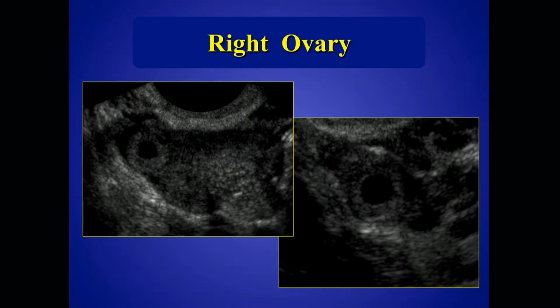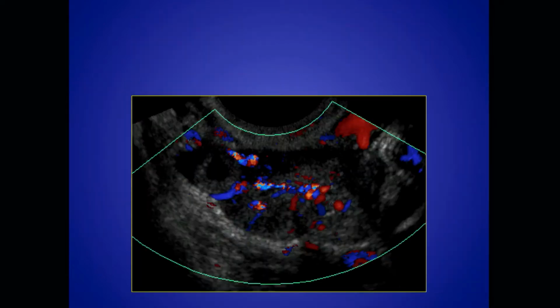Patient was asymptomatic, so I said, I'm a little bit concerned about this. There's no IUP. I see no other evidence of an ectopic pregnancy, and I see this eccentric cystic mass projecting from the ovary. Color showed flow around it, and in fact, those vessels were coming from the ovary itself. And that's where color was telling me that the vascularity to the mass was coming from the ovary. So I said, I guess it could be an exophytic luteal cyst, but it did have an echogenic appearance.